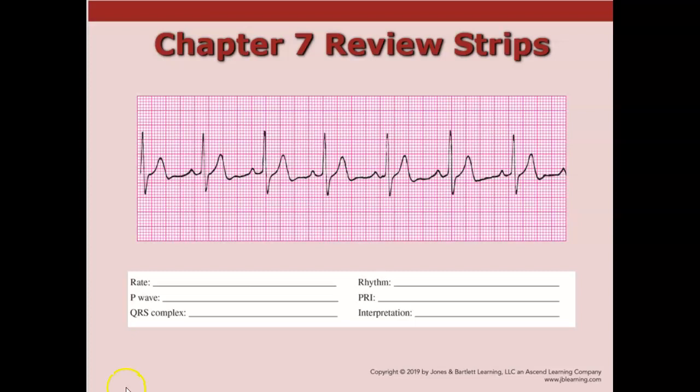All right, guys, let's look at some rhythm interpretation. These rhythms are from prior curriculum, but I have access to them, so I thought we would just look at these and talk about these as a whole and walk our way through diagnosing these guys. So, first thing, remember you have these 5 steps.